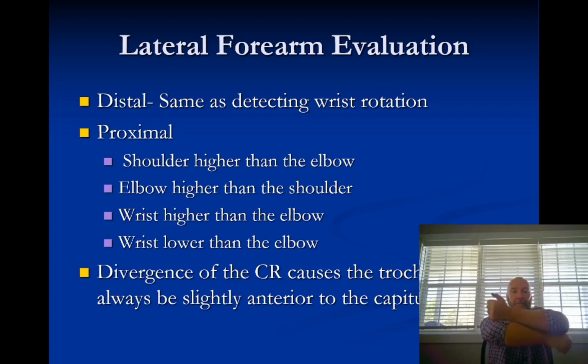If we've got separation between the two and the side that's furthest from the image receptor is distal to the side that's closest to the image receptor, that indicates that the shoulder was elevated and the elbow was depressed. Instead of getting everything in the same plane, you just had the patient sitting upright, and you've got that going on.